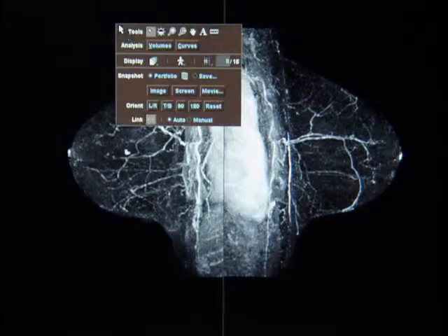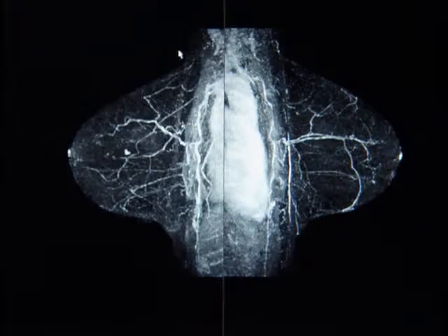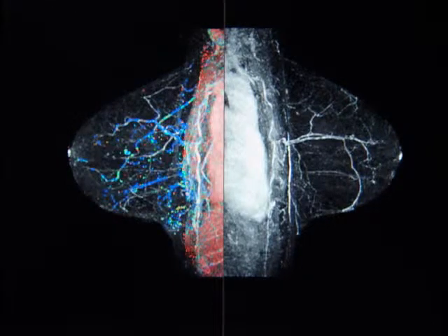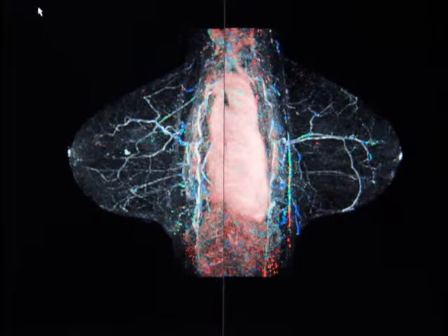I will generally image this screen save for the portfolio that my physicians that refer to me have become very accustomed to looking for, and then I occasionally will add on the color parametric mapping and film that, but in this case it really doesn't add anything.